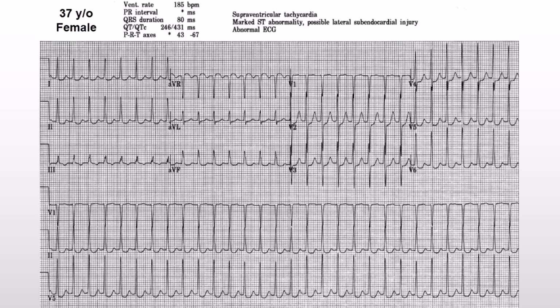In the His-Purkinje system, as the heart rate goes faster and faster, the QRS complexes will get narrower and narrower. That's physiologic. We expect that, and it's a good thing. The rhythm is very regular. However, I don't see any P waves.